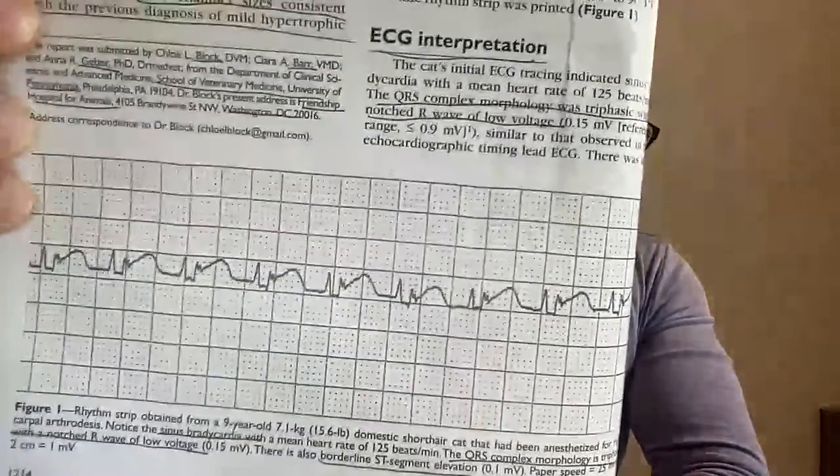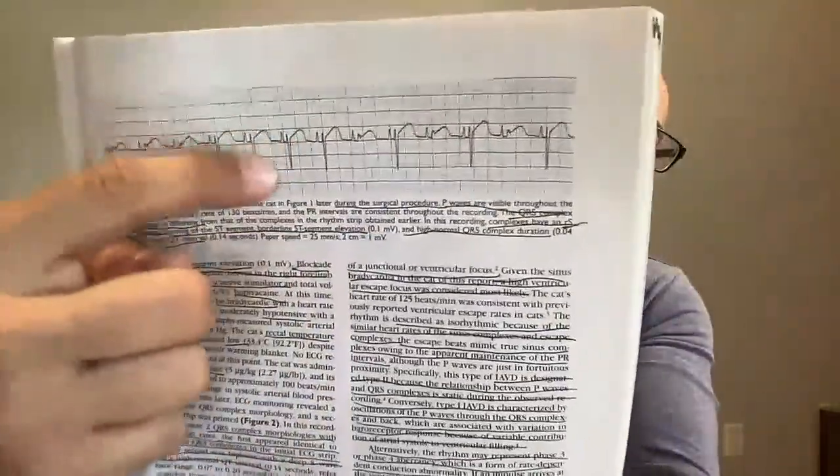So that's what that is. If anybody wants to look at that and try and figure that out, it'll be more evident with the next ECG, which is this one here. You can see how things have changed. See how now you have these spiked areas here. So that's the main focus that I have on here.